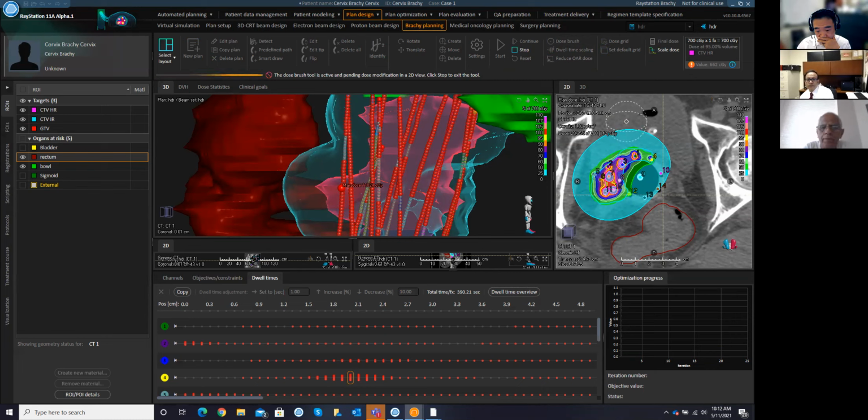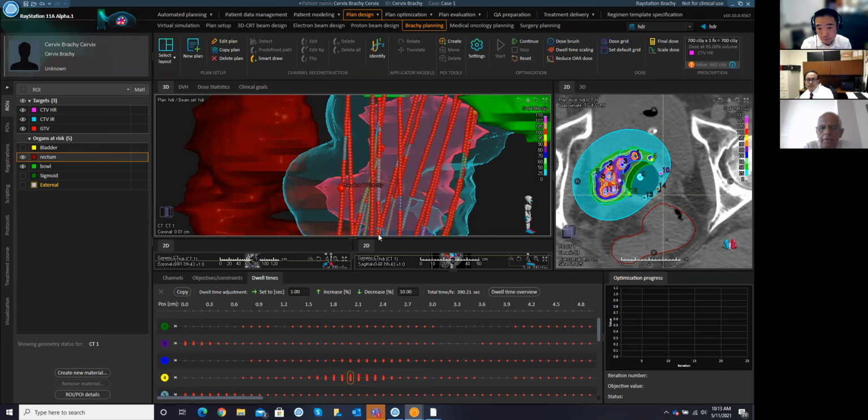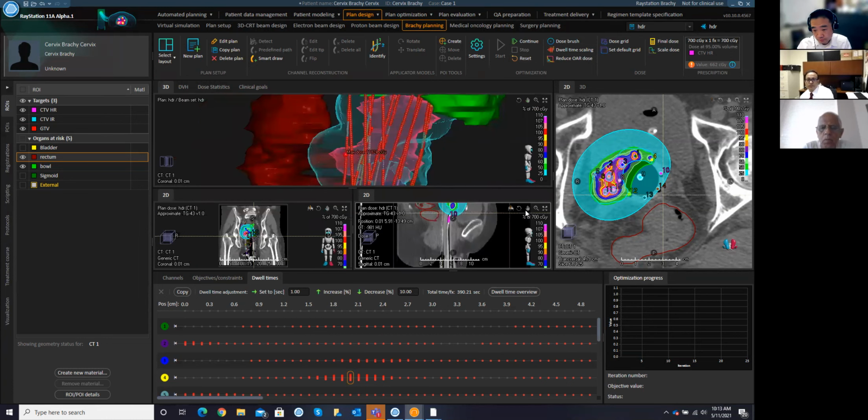I think it runs an optimization to get the same dose as you have, but with a lower dose within the sphere, and as much lower as you pull. But I really think that with the optimization, you shouldn't need it. I understand.